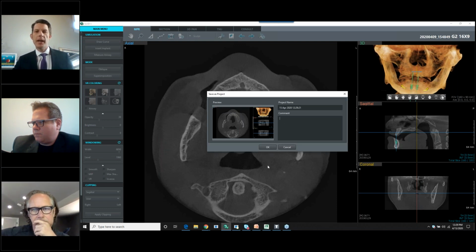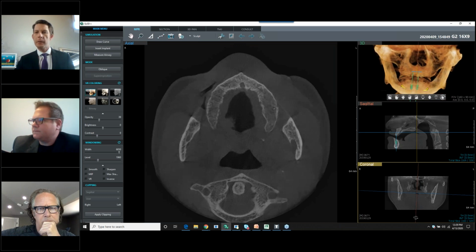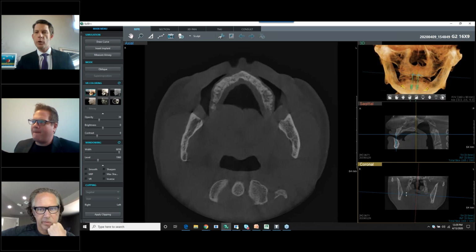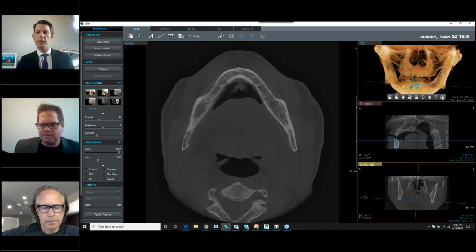If I have to recreate that orientation, I just go back to my project and it automatically corrects. Currently I don't have an autocorrect where we can lock that, but we've talked to our developers about adding a way to adjust this and lock it specifically for malpositioning issues. That's why it's so important to make sure we don't have any patient movement and that we are properly positioned. Dr. Engel talked about the overlay of the STL file.